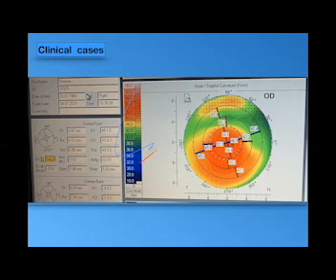So if we measure the mean K, we will decrease the impact of this center point. Yes. لو احنا حسبنا 40 و 44 المين بتاعهم مش هيبقى matching مع ال 45 and 50 in the same circle. So the same point, the same circle is considered. So the difference is high.